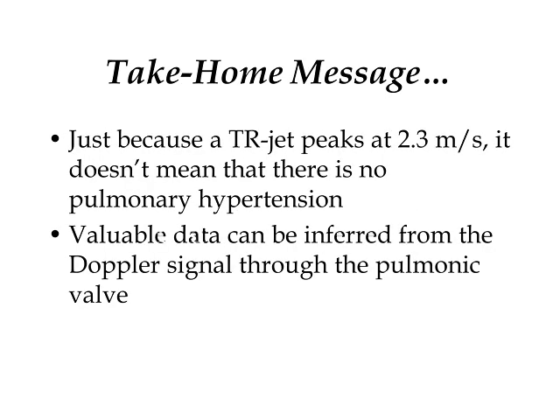Take-home message is that just because the TR velocity may not be as high as you would expect it to be if a patient has pulmonary hypertension, doesn't mean it's not there. And we all know in echocardiography that echo can never overestimate a velocity. We can only underestimate it, especially if a jet is very eccentric and the beam is not parallel to the flow.